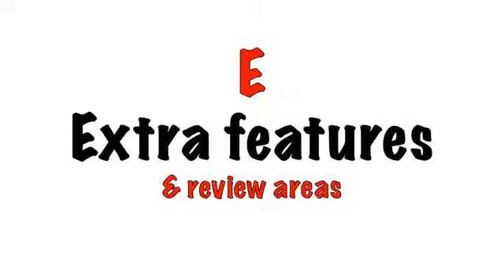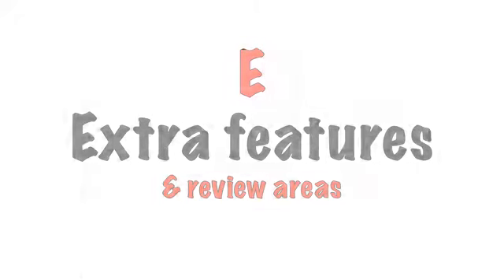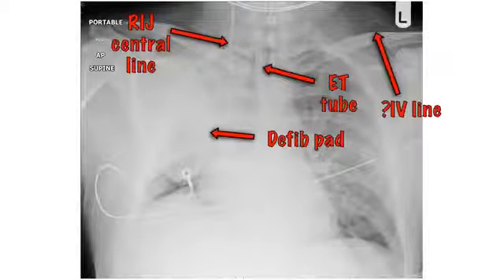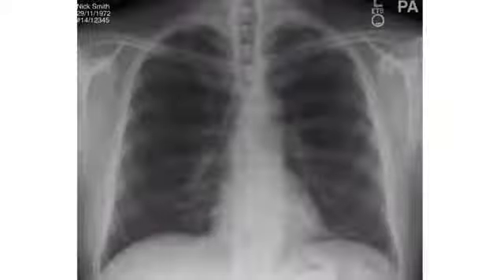E. Extra features and review areas. Look for evidence of medical intervention. For example, monitoring equipment, lines and tubes. Are they correctly positioned? If the chest X-ray appears normal so far, pay attention to the review areas.